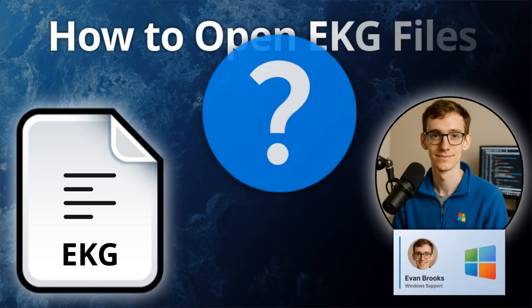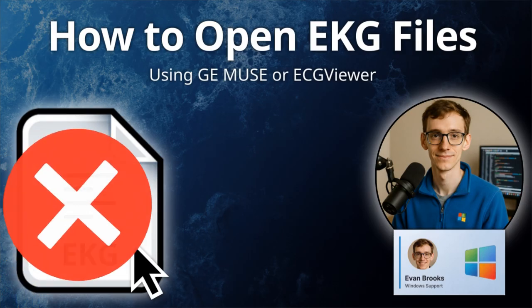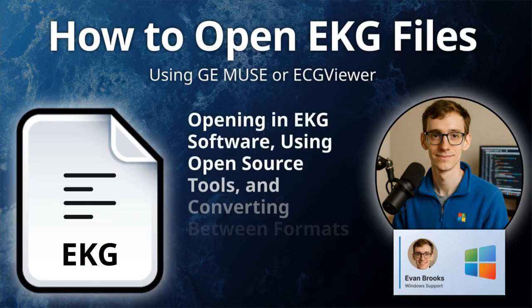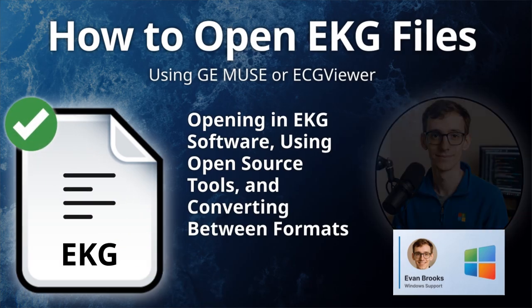Working in cardiology or medical research and have an EKG data file? This contains heart rhythm recordings from electrocardiogram equipment. I'm Evan Brooks, Certified Support Engineer, and I'll show you how to handle these electrocardiogram data files.